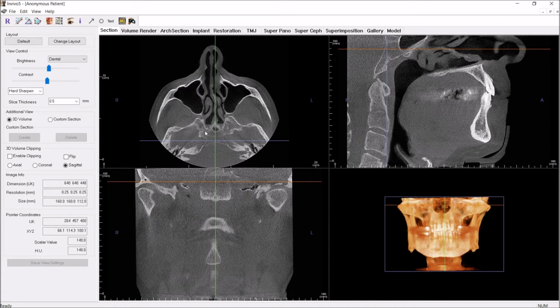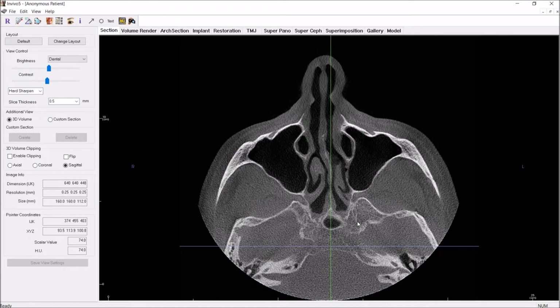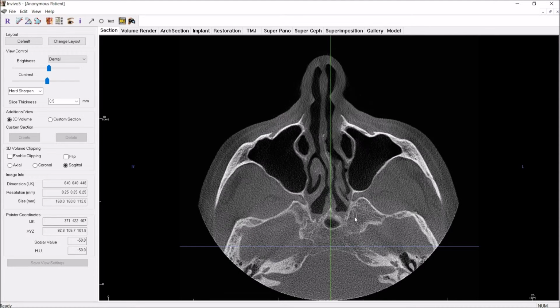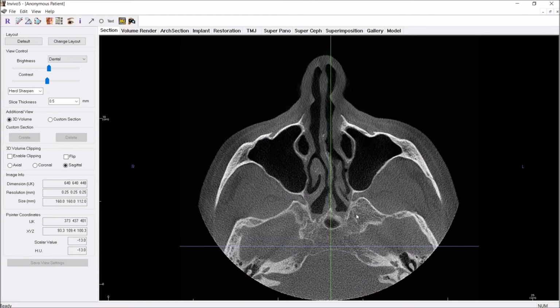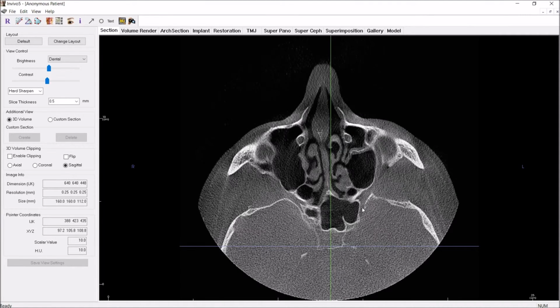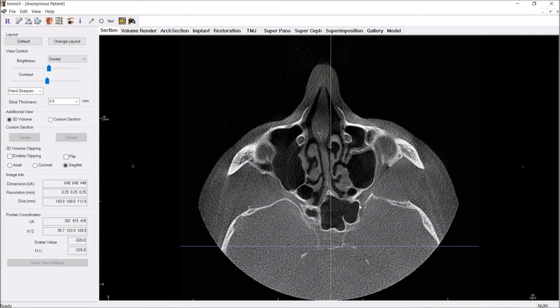And here you see a couple of canals. They're bilateral, they're symmetric. Blow that up. And these extend as you follow them forward into the pterygopalatine fossa. And this canal is pretty easy to remember because it's just the pterygoid canal, also known as the Vidian canal. And some people will confuse this with the foramen rotundum. Foramen rotundum you'll see as you scroll more superiorly, and that projects here out of the pterygomaxillary fossa.